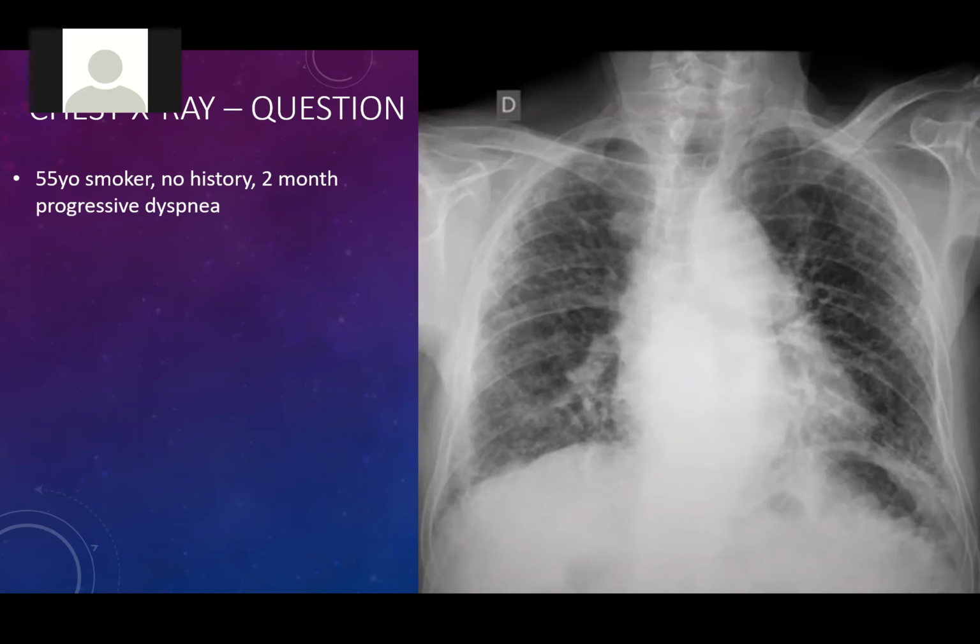I can see opacities on the right at the borders. Yes. At the left side of the heart, there's a consolidation. I don't know if it's infection. You mean maybe this area? Yeah. Okay. But everything is normal, I mean, in a systematic way, you can count ribs. The clavicles are okay. There's no rotation. I can see the trachea and the bronchus, 2 bronchi.